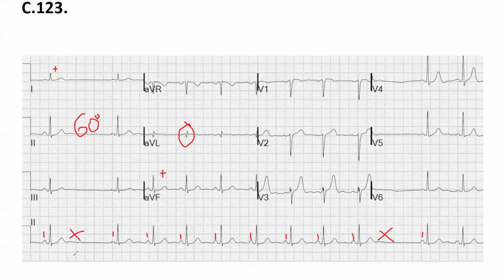Sorry, just give me a second. I'm just trying to figure this out real quick. No P wave. So let's say it's a normotopic impulse abnormality. It can be sinus arrest. Very good. Or it's just a normal sinus arrhythmia.